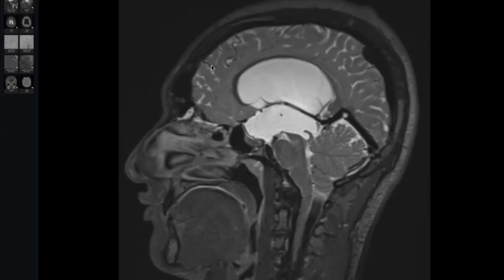You did very well, but take care of these very fine mistakes. Thank you so much. This is a case of supratentorial hydrocephalus due to web. This is a web. My arrow is visible for all of you or not, my colleague? Yes, it is visible.